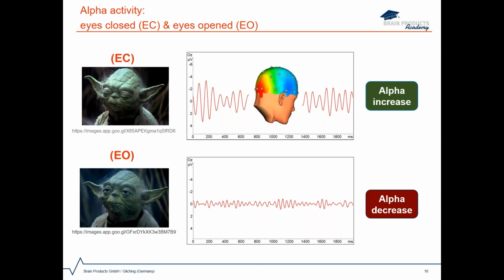In this demo, we will show you how to perform FFT analysis in Analyzer and validate the already known hypothesis that alpha activity increases when the eyes are closed, resulting in a larger spectral power in the alpha range. All right, let me open Analyzer.